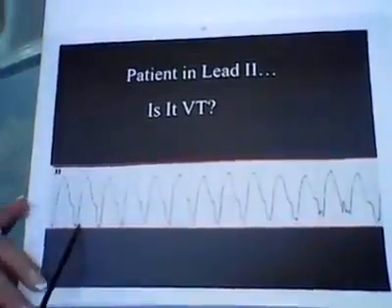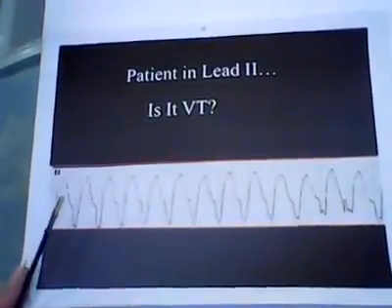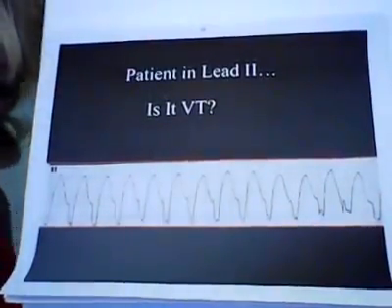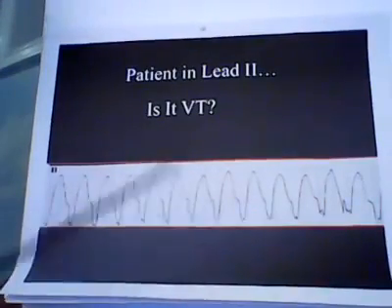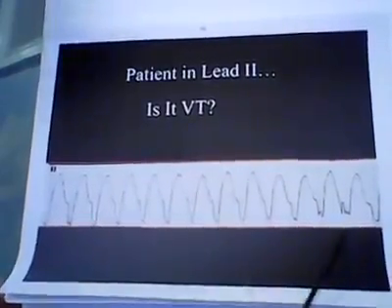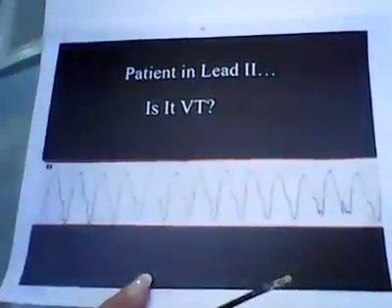Now, not for nothing, when you look at this, it looks like some kind of an emergency. I know if EMS wheels someone into the ER, hooked up to a life pack showing this, people would get up. And not that you shouldn't get up, you should, but it's not what you think it is. It's not VTAC. It looks like VTAC, but it's not. Let me show you the 12 lead.